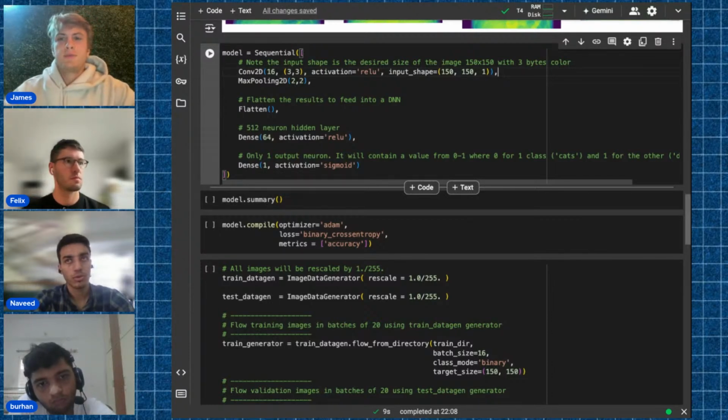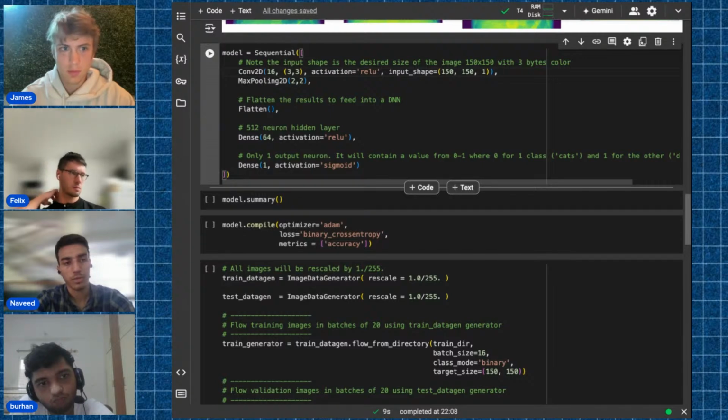So because we would like to have labels at the end, we can then put a threshold, say 0.5, where we say if the probability is greater than 0.5, just make it class 1. And if the probability is lesser than 0.5, just make it class 0.